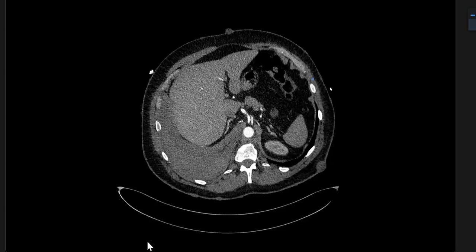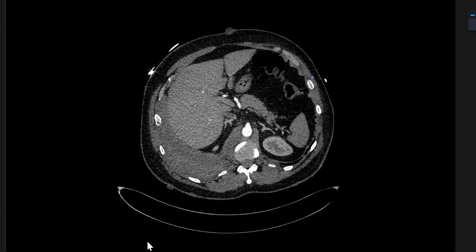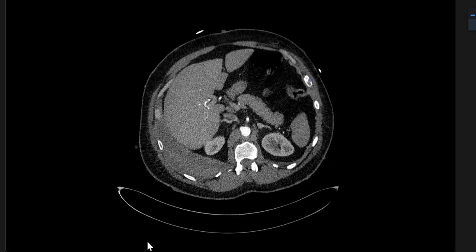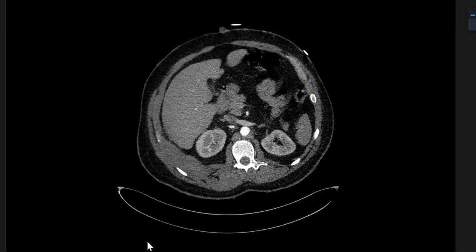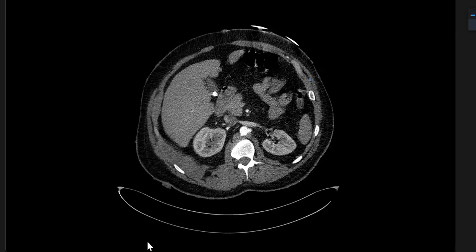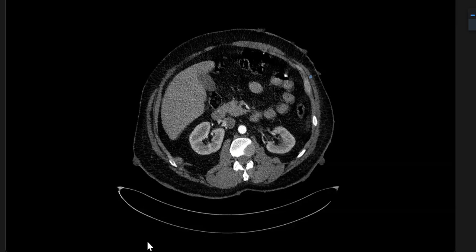What do you recommend in this? You are the registrar on call or acute concern on call. This scan is being reported, and the radiographer is calling you, saying, Doctor So and So, the patient is on the table. What do you want to do? Anything else? Are you happy with these images? Can we send the patient back to ER?